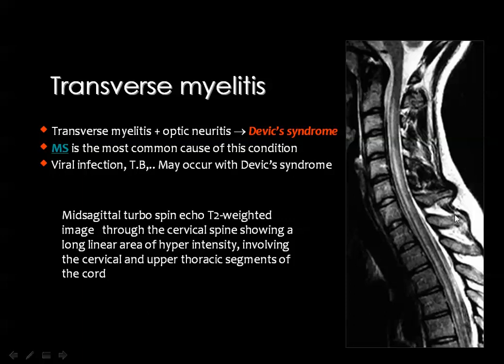In this MRI sagittal T2 weighted image of the cervical spine, there is an extensive intramedullary high signal intensity involving most of the cervical spinal cord and extending to affect the upper dorsal spinal cord as well. Then this lesion can be explained on the basis of the clinical situation of the patient, and sometimes it can be a manifestation of MS in the spinal cord or multiple sclerosis, and maybe a manifestation of ADEM or acute disseminated encephalomyelitis, depending on the patient clinical condition.